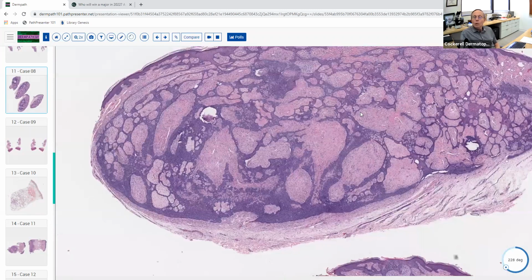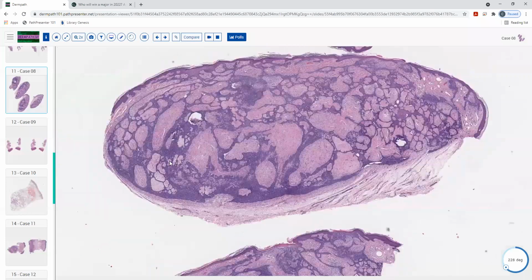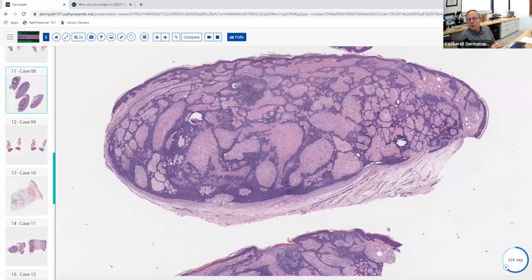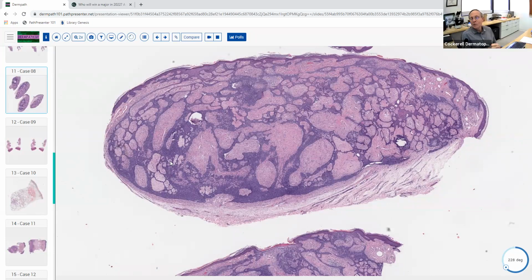And what do people think that is in general? A variant of a basal cell. Yeah. And it probably really and truly isn't. But sometimes you'll see areas that really look like a classic basal cell, but it's really more of an adnexal tumor that's probably coming from these primitive mantle cells, and it forms these little strands, these anastomosing strands and cords, like you said.